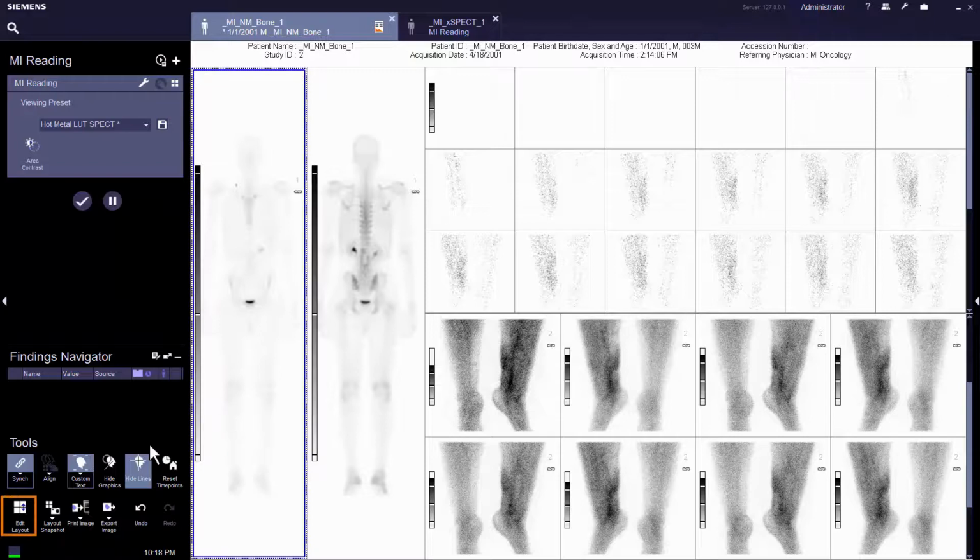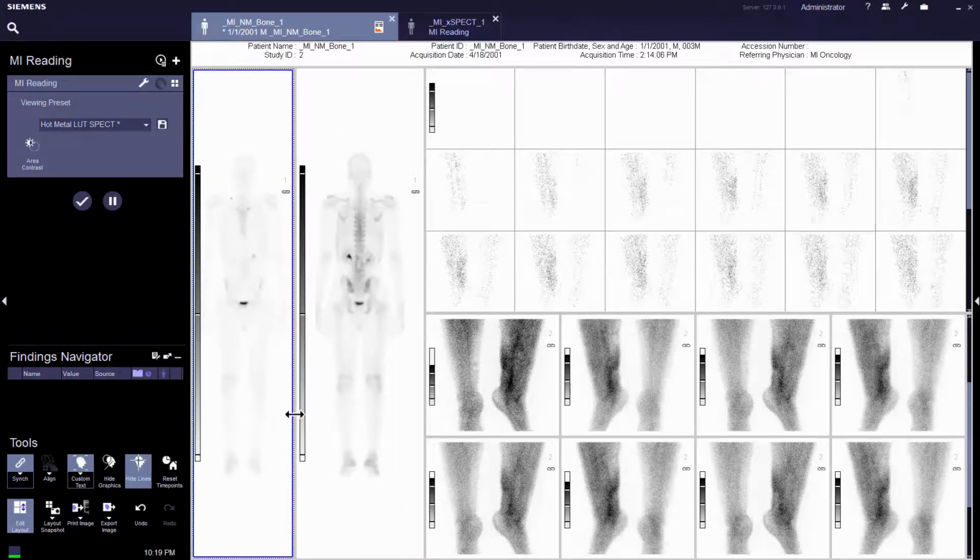The Layout Editor will allow you to manipulate the segment size. To turn on or off the layout editing mode, simply click on the icon. The segments will be highlighted, indicating the tool is active. To manipulate the segments, simply click, hold, and drag to the desired size. To turn off the layout editing mode, simply depress the button.